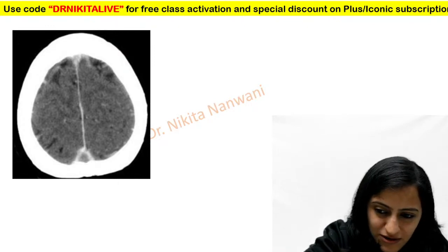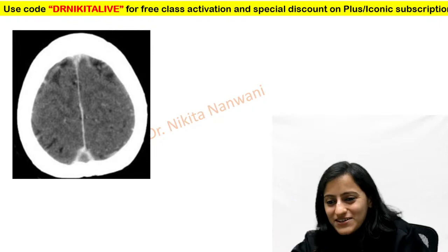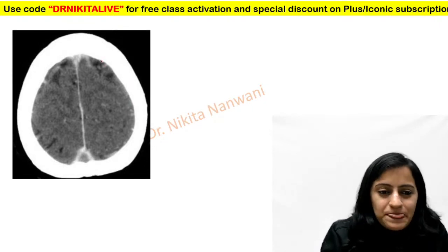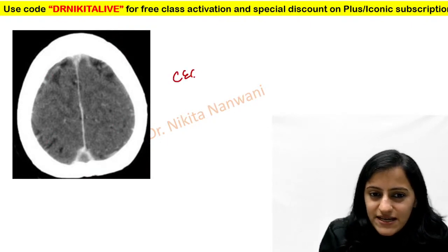You are close, Vivek, but this is not lateral sinus. No. Very good. Archana, absolutely right. This is, yes, Anisha. Now this is a contrast enhanced CT.